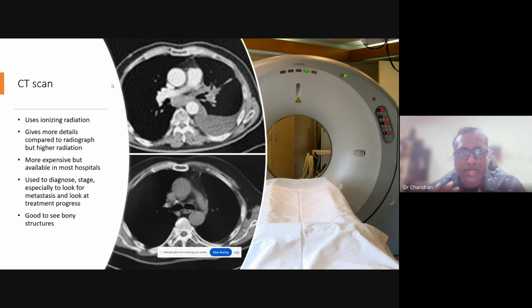They look very nice and you can actually see when there is an area which is abnormal or an area which is normal. So a normal lung, which is similar to the air outside your body, should be black in color. All right. So any other color that you have in the lung, there might be something wrong with it, except for the vessels in the lung, which are not air containing, but anything containing air should be black in color. And we always love to compare right and left because it's very simple, because whatever is on the right should be on the left. With the lung, we have two lungs, so we just have to compare both sides.